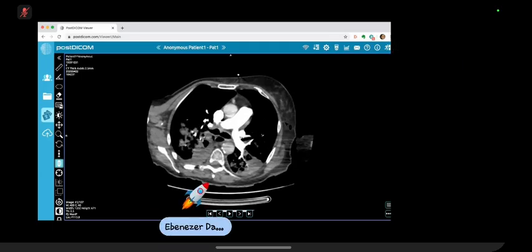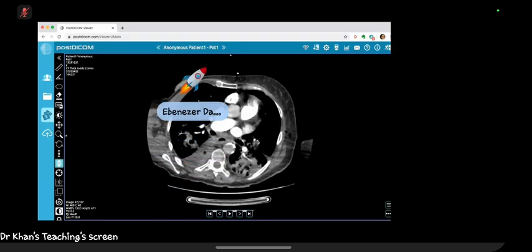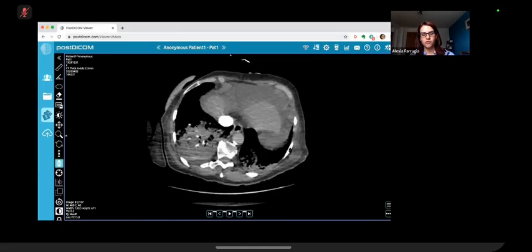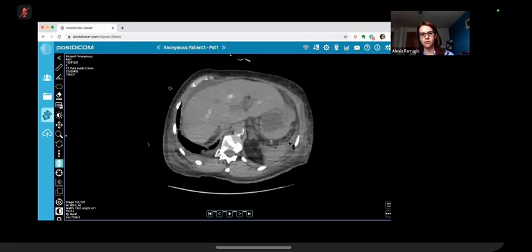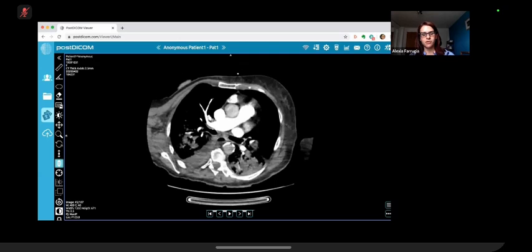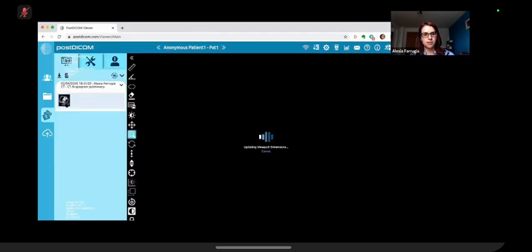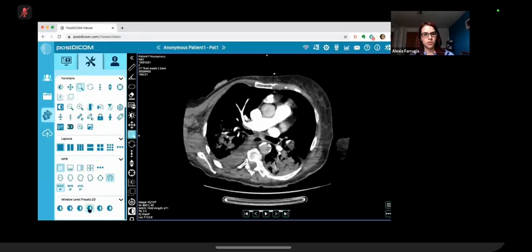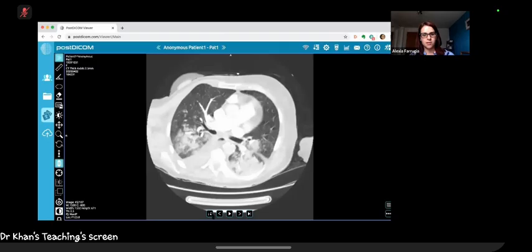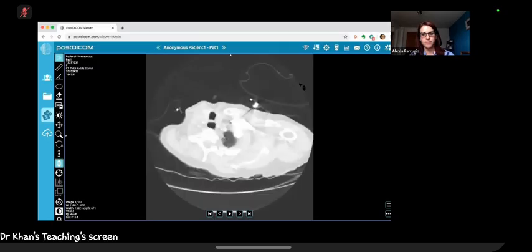All right. So it's a pulmonary angiogram. Actually, it wasn't done as a CTPA. In fact, there is opacification of both the aorta and the pulmonary trunk and the pulmonary vasculature. So it was almost done as a kind of a triple rule-out scan. I will change the window to the lung window, and I will scroll through that again.